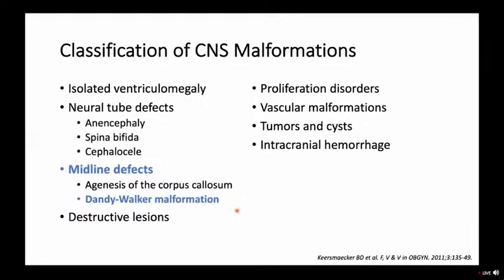Let's do one other fetal head abnormality. I like to talk about Dandy-Walker malformation. This one's important. The importance of this one is related again to the accuracy of the diagnosis and what terms we're using. I think this is a pretty uncommon one, but it's really important that we use proper terminology because it predicts the prognosis.